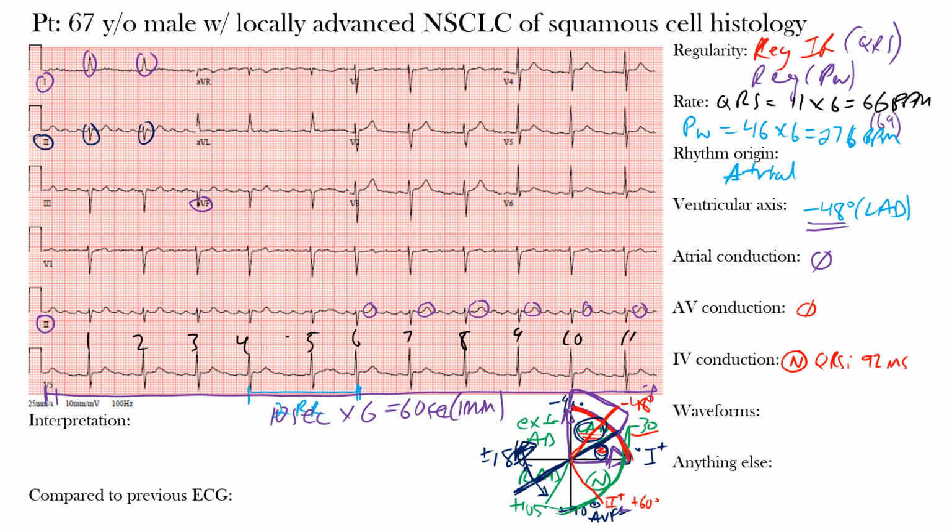The ST segment elevation in some of the precordial leads that you may see is not significant, okay, and can be reassured with that concave morphology and the patient's presenting symptoms, okay? No chest pain or shortness of breath or anything that we think of as more cardiac related. The QRS interval we said was within normal limits. The QRS amplitude does not seem to be abnormally increased or decreased throughout the EKG.